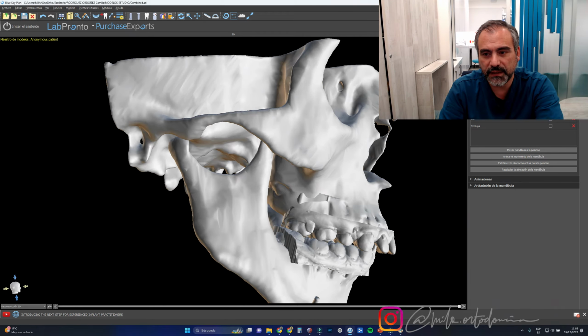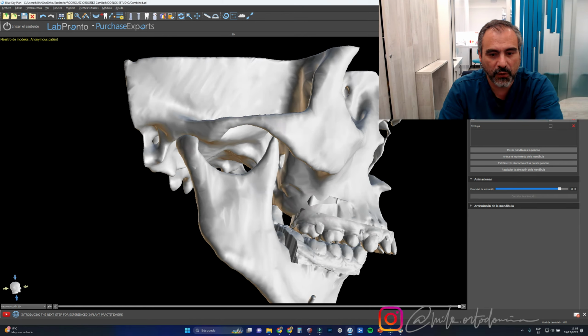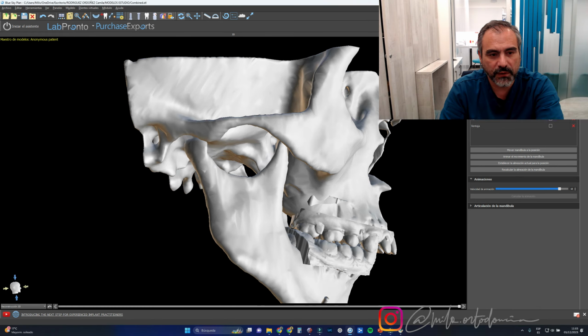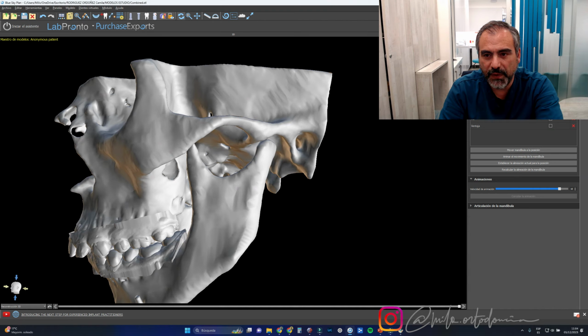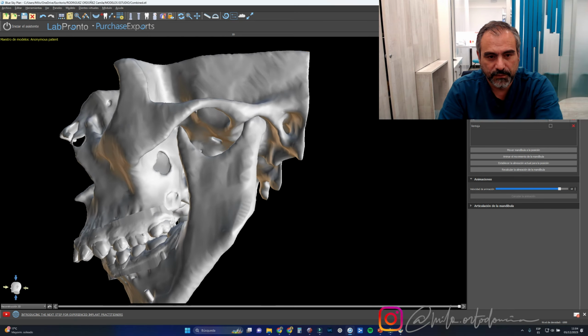And now if we take this case to centric relation, we're going to see how the condyle is going to be centered with respect to the fossa. It is in this position where I want to start my treatment, and of course the overjet of my case increases. Let's look at it again. And we will see, won't we, how there is that condylar distraction from one movement to the other. In the other condyle, something similar happens. This is the position in which the MIC is, and this is the position in which it is in RC. MIC and RC. Isn't that right?